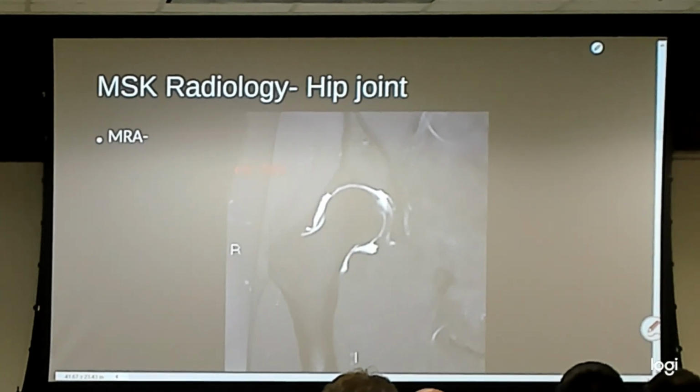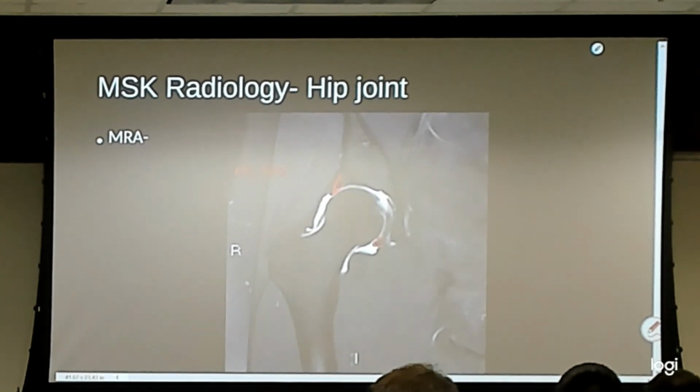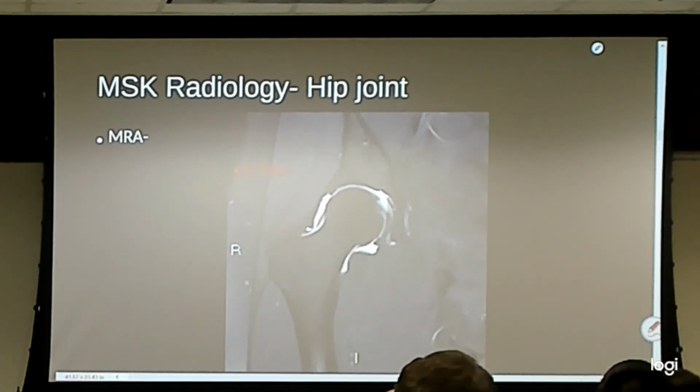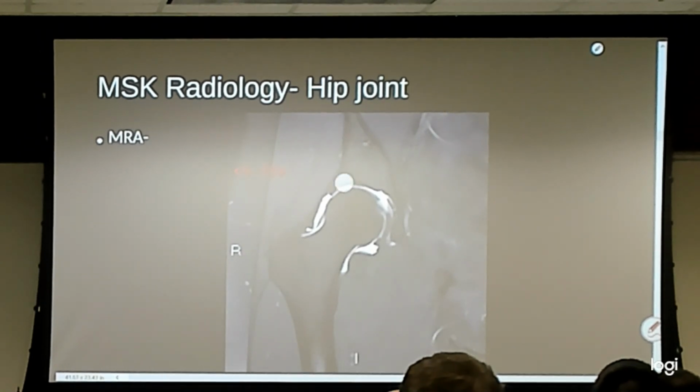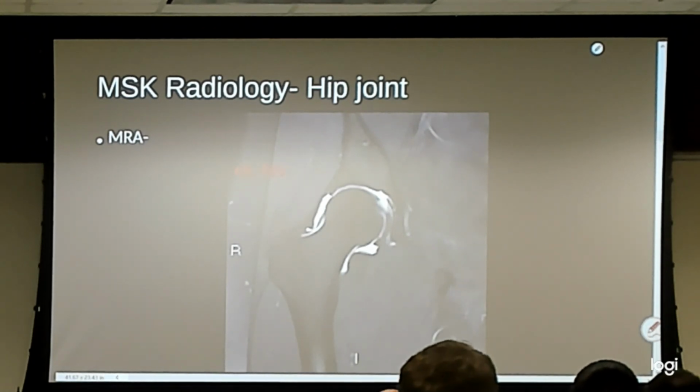Here we've got a zoom in, so we've got a little bit better view of both of the labrum. Labra. Yeah, sure, we'll go with that. We could follow that by scrolling forward and backward and seeing kind of how that consistency changed. There's a notch in this one. If you're seeing that, you are true. You see that notch. There is a normal variant where there is a little notch there. It has to do with where it goes from bone into flesh. So you can get a normal variant notch there. So really rely on your MSK radiologist when you start seeing subtle findings like that.